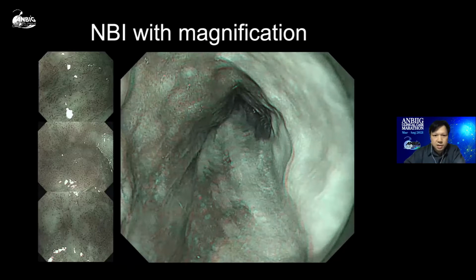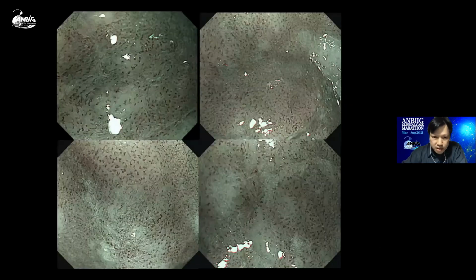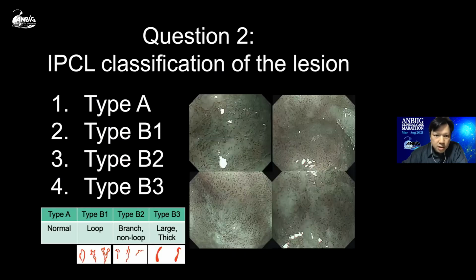After observing the IPCL, here is the key picture of the IPCL. What kind of IPCL classification of the lesion do you think? Please vote. I also give the reference of the IPCL classification.